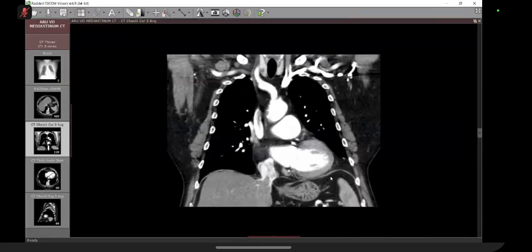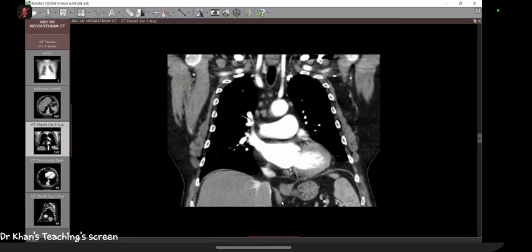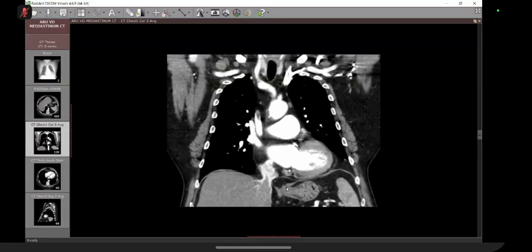Let me make it bigger. This is the left crus and this is the right crus. Now it is passing through it. For example, if there was a carcinoma here and it invades the crus, you will see it better on a coronal and at times on a sagittal. If it invades the crus, it is T4A once again. Not bad news because you can still do surgery, right? But left main bronchus, aorta, trachea, gone. That is T4B. Okay, so these DICOMs are finished.